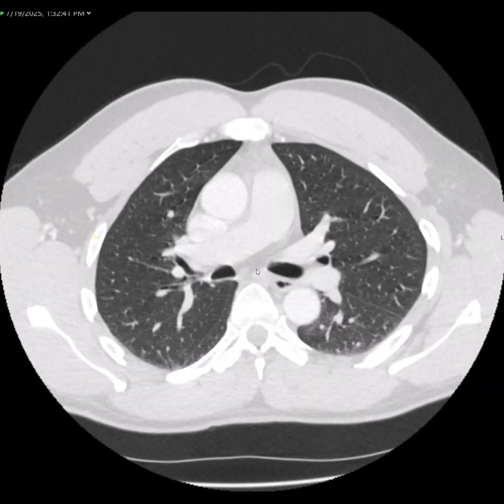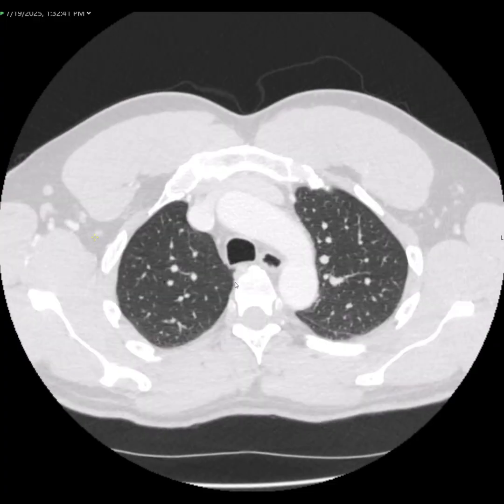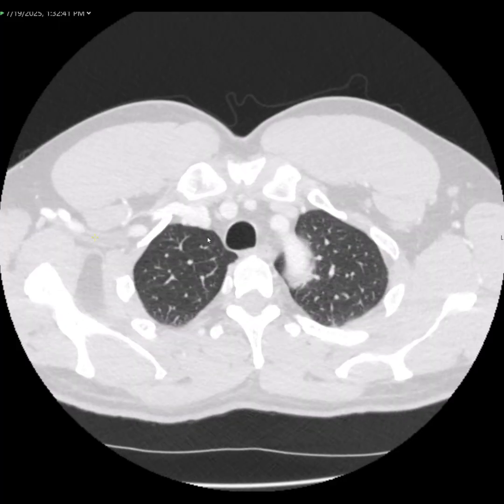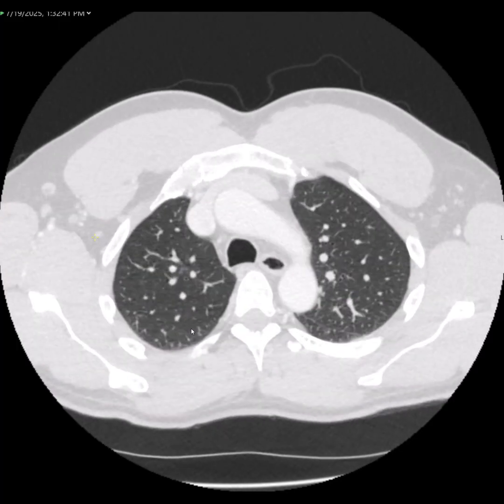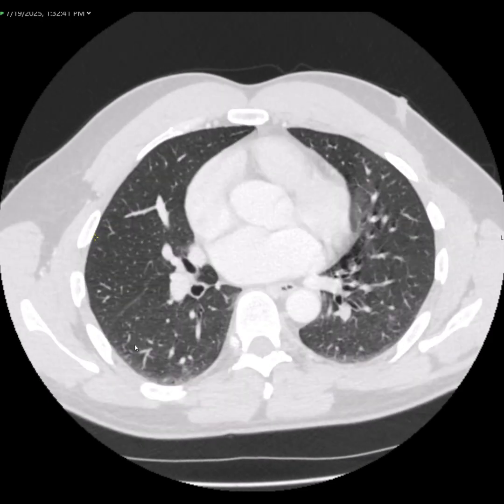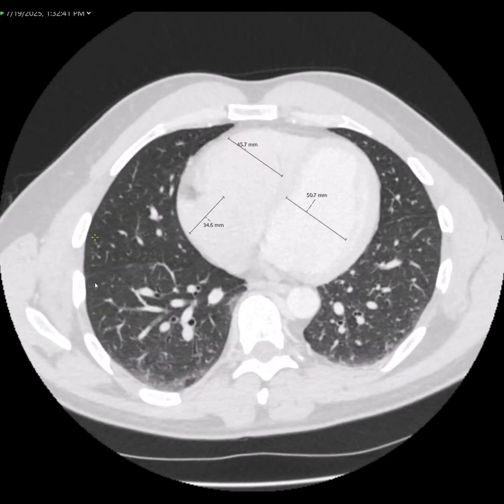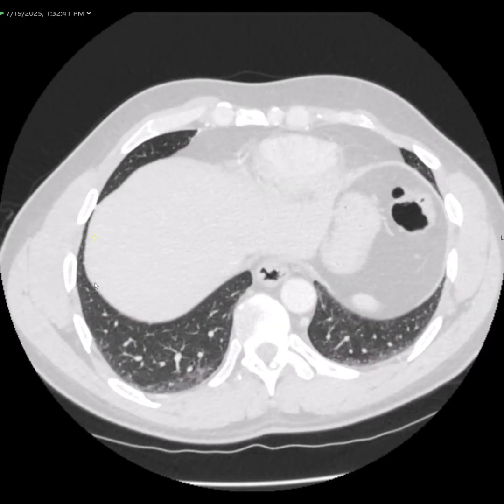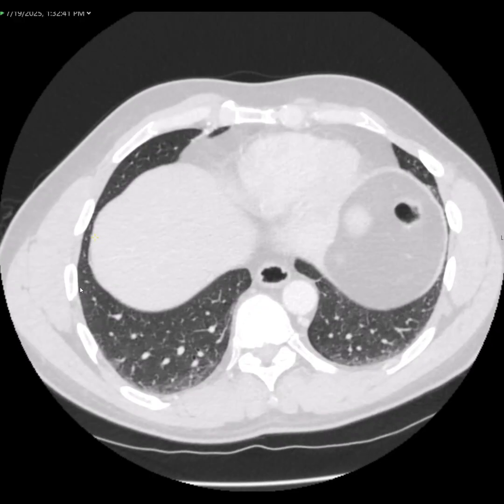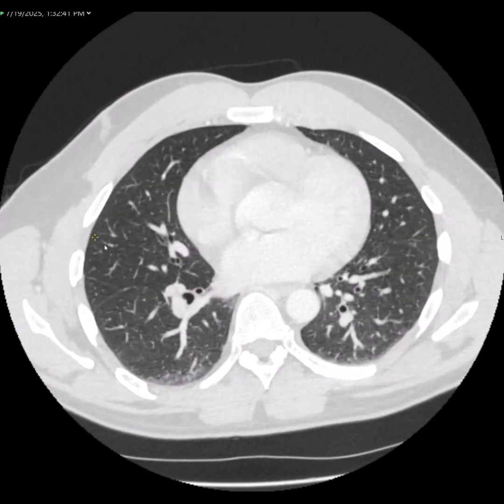Next, you want to examine the pleura, which you can start from the top. You want to break your lung regions into roughly 6 sections, bottom, middle, and upper for both sides. You want to follow the pleura down, looking for any abnormal lung findings, any sort of hemothorax, pneumothorax, effusions with loculations, or any plaques, and everything looks normal here.